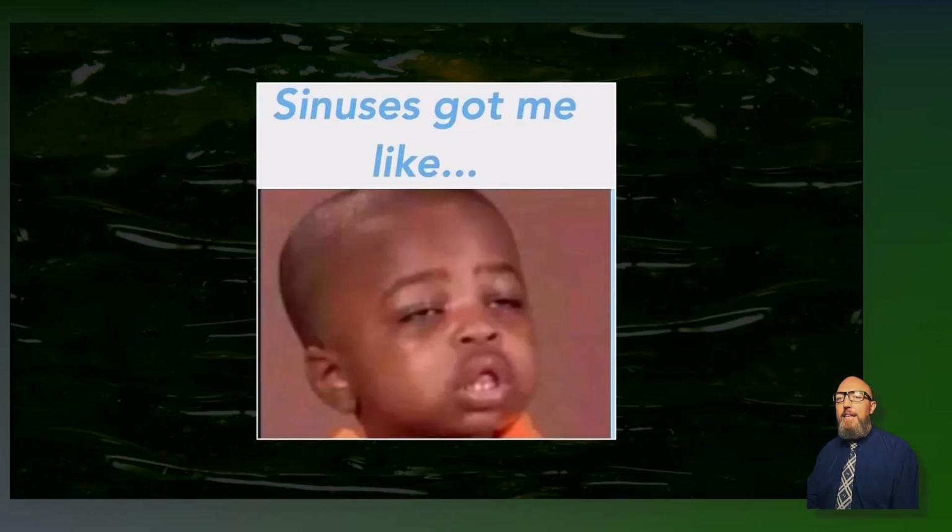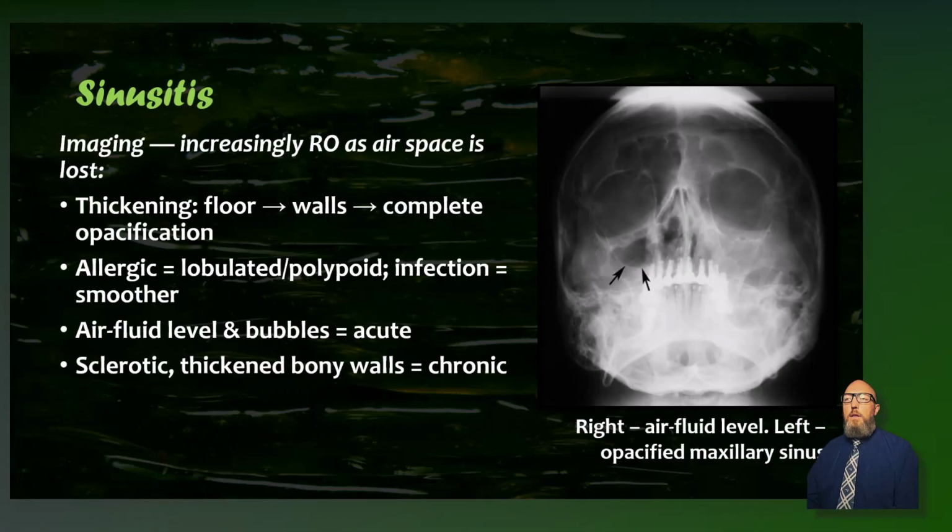And for anyone that's had this, maybe you feel like this. Maybe you identify with this picture. Sinus has got me. And so the imaging, I kind of started talking about this on the last slide, but this is heavily tested. So hold these two patterns clearly. As the airspace is lost, the sinus grows increasingly radiopaque.